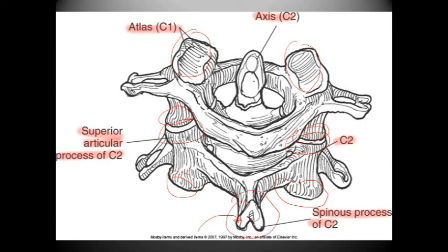And notice how the odontoid is actually situated more towards the anterior arch than the posterior arch. We have the transverse foramina, once again to allow passageway of vessels. We have the transverse process. And we have the intervertebral disc.